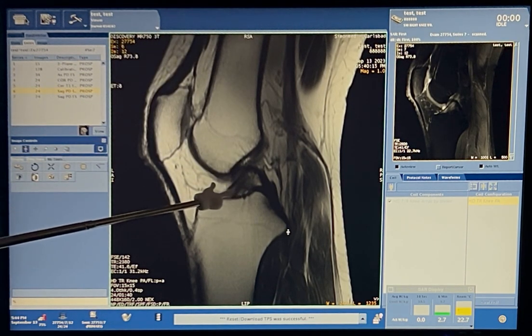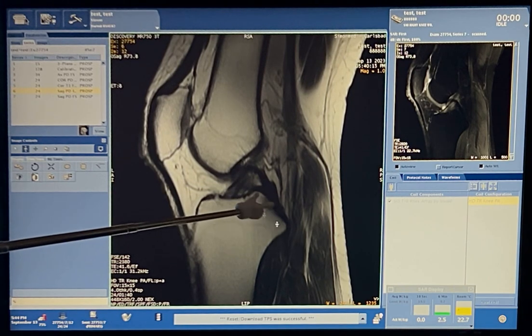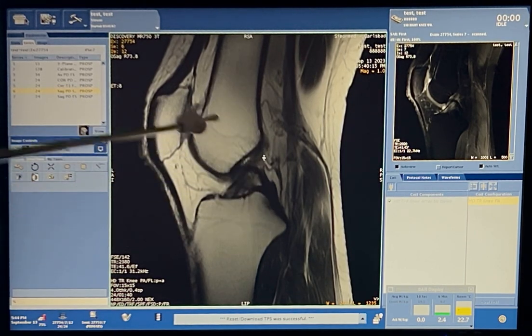Okay, so over here, that little frayed looking weird thing, it's because we got a weird slice of it. That's the ACL, anterior cruciate ligament. And then here is the PCL, the posterior cruciate ligament. And now these cross like that, hence cruciate, as in cross-like.